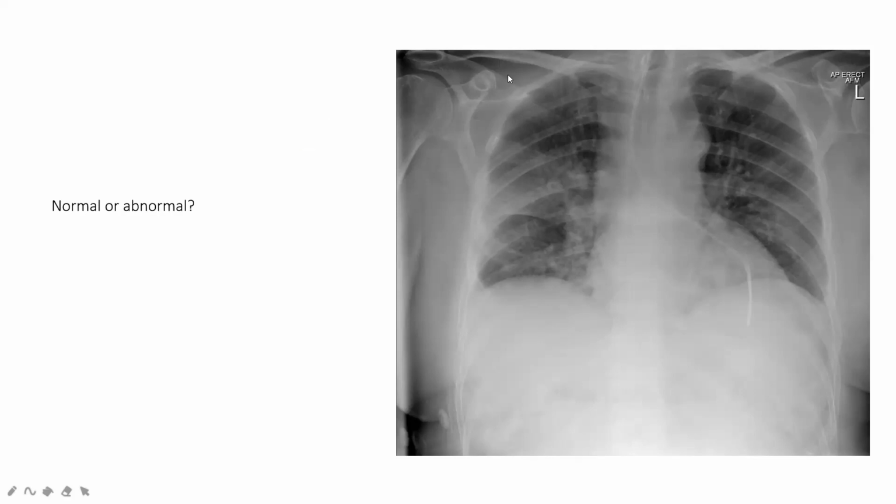Okay, so well done to those who said this is abnormal. So it crosses the thorax in the midline, that's good. It looks like it is bisecting the carina, but if you notice, at the point of carina, it is changing course. If it was normal, it would have just gone straight down without changing direction, but it is changing course at that point.